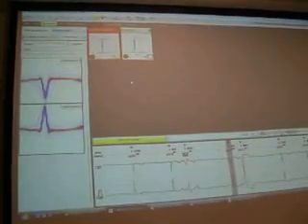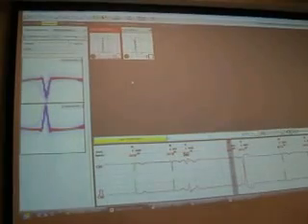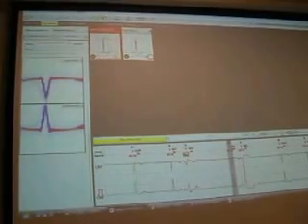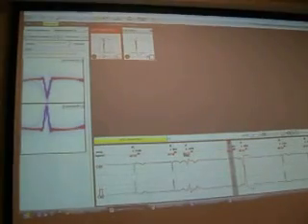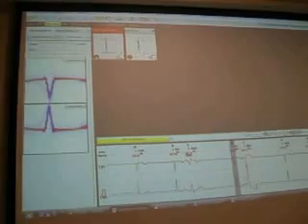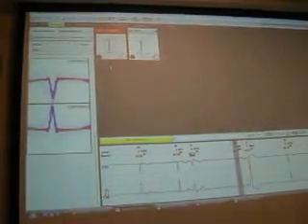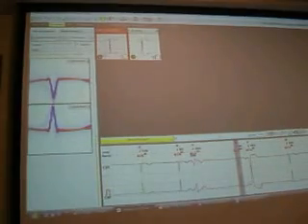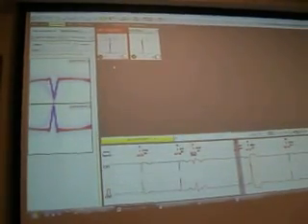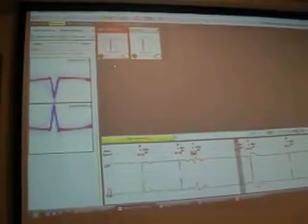What is very important? Very important to make the clusters clean. It means that there shall not be red parts on this circle. If you can see some red parts, it means that this cluster includes different QRS shapes. I will show it.